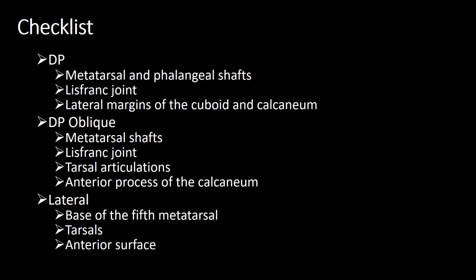Most hospital protocols for the imaging of the foot is for DP or DP oblique. However, if there's any possibility of an injury to your tarsals, or to the base of your second metatarsal for your Lisfranc joint, you need to go on and do a lateral view. And that's because quite often you will get tiny avulsion fractures to the anterior surface of your tarsals, and this is only appreciated on your lateral view.